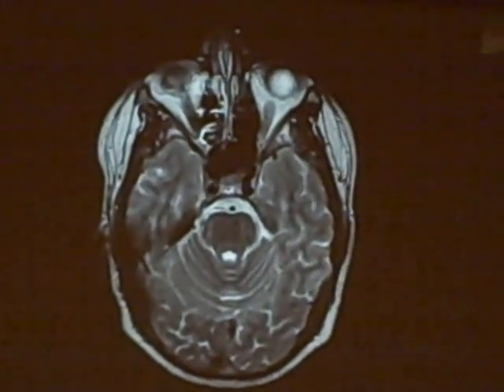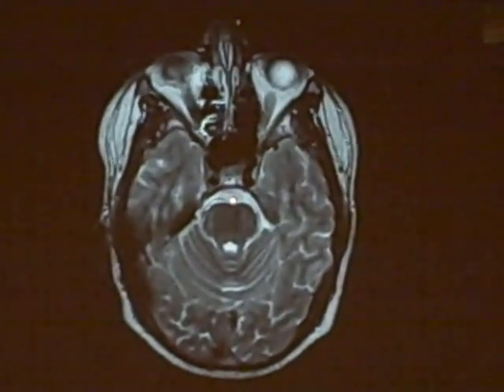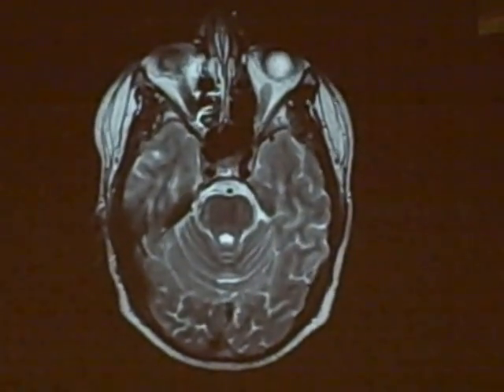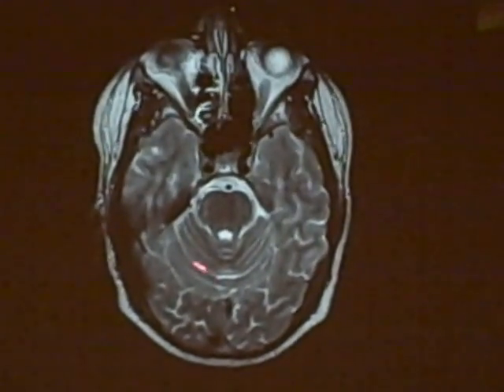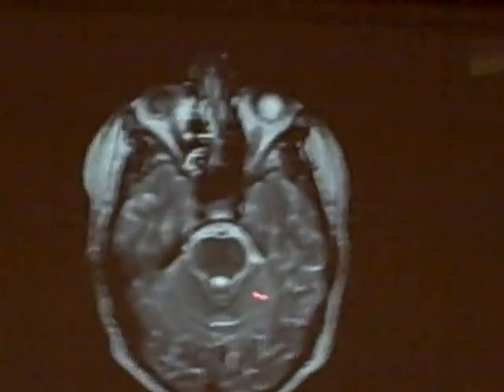Coming back here to just another kind of random image. This is still the pons with the basilar artery lying right on top of it. And the cerebellum, the gyri and the folia are much smaller, so we can usually make out the difference here between the cerebellum and just look at the cortex out here in the hemisphere. So this is still the cerebellum.